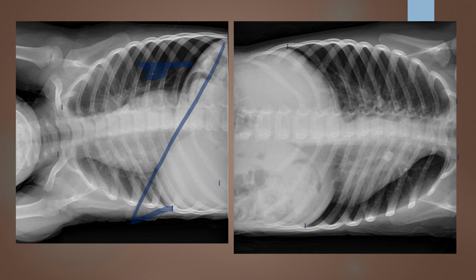So the next thing I'm going to look at is my mid-coronal rotation. We're looking at our SC joints here and here. And really there's very minimal rotation, if any at all. If we look over here, we can see spinous processes are towards the side.